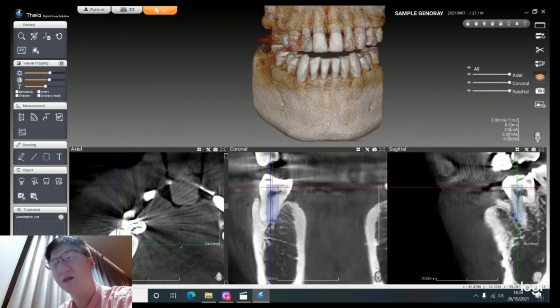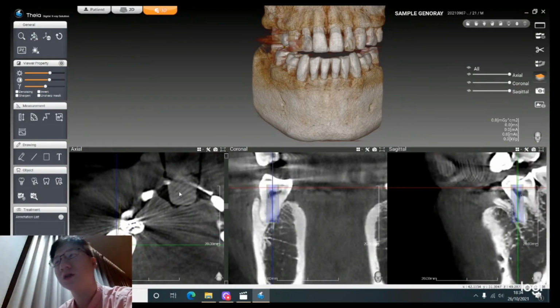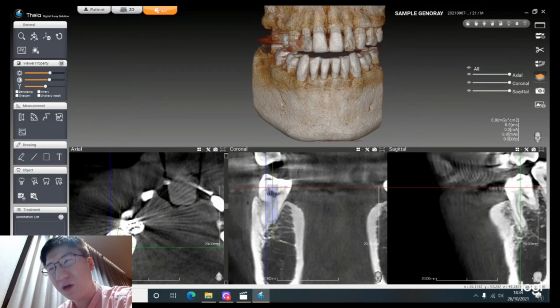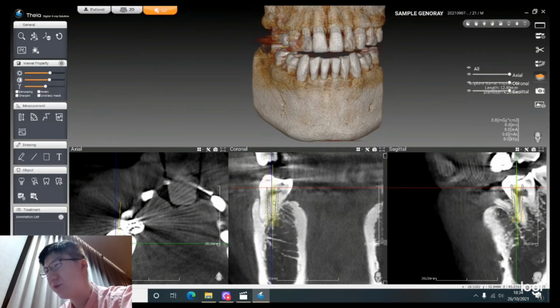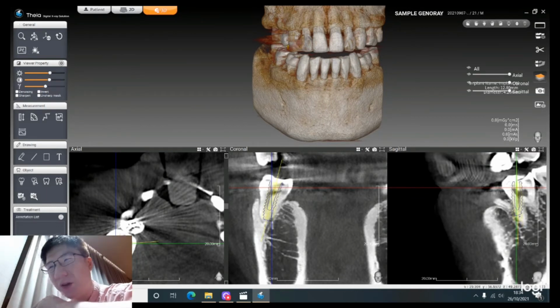And I have placed my region of interest in the implant. Oh, sorry, I'm still in screen centric, so I want to be in crosshair centric. Yeah, where the lines move. So now I've placed my region of interest on the implant, so you can actually see the implant on the coronal view as well. You can move your implant, you can rotate it if you want to be rotating the implant. Okay, yeah, that's just very nice.